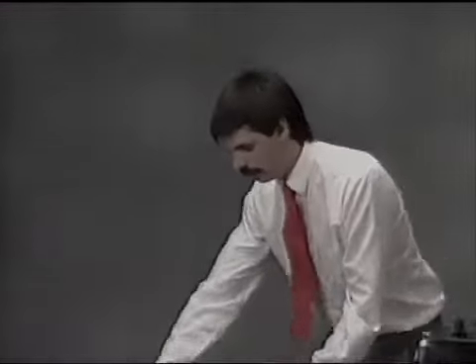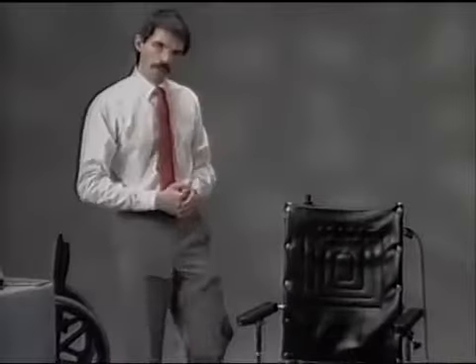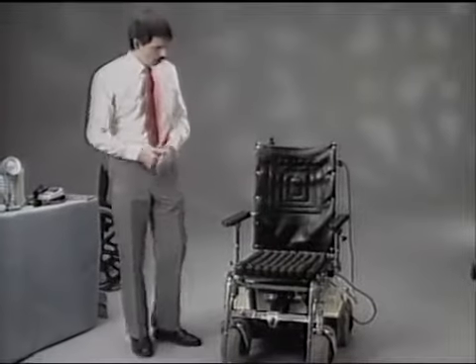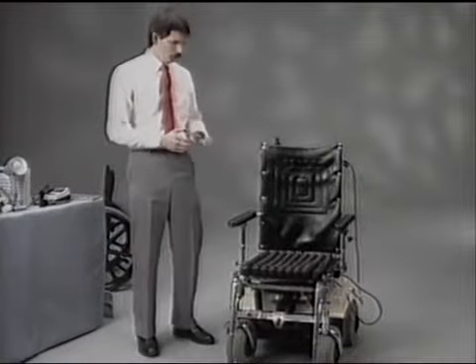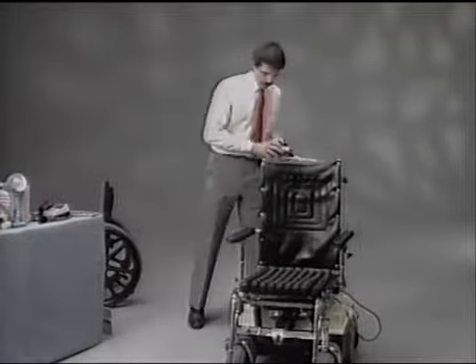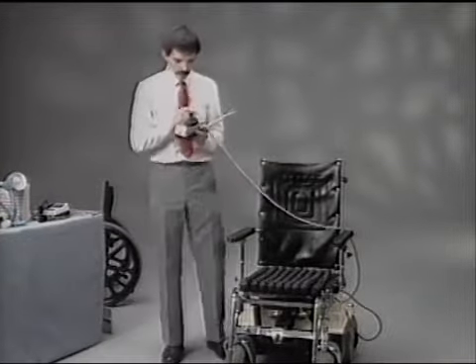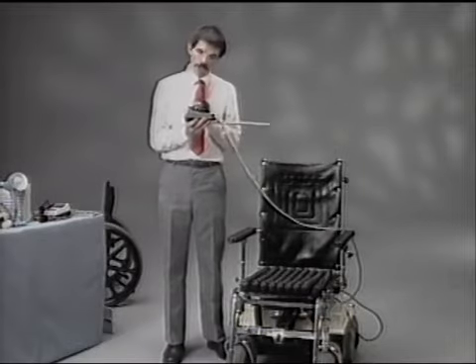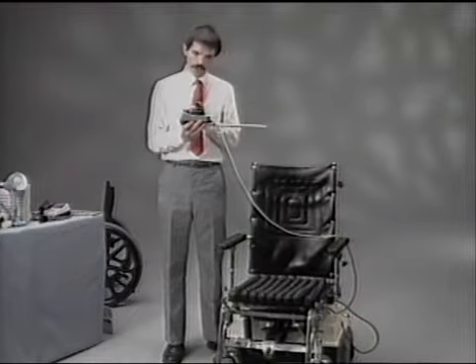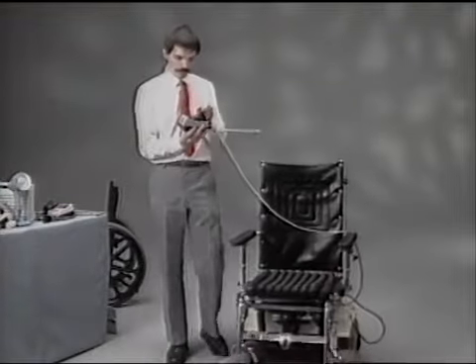And let me just slide this one over here. This particular power wheelchair has a seating system called a Roho cushion, and it gives an air flotation above the seat, and it gives a very smooth seat to sit on. This particular wheelchair is driven using what's called a proportional joystick. A proportional joystick is designed so the farther I move the joystick, the faster the chair goes. If I push this just a little bit, the chair moves very slowly. And if I pull it back a little bit, it moves very slowly in reverse.